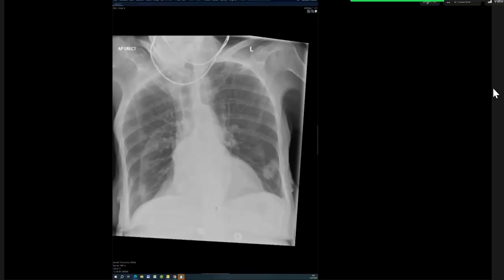There is no appreciable hiatal hernia lower down, so I'm wondering whether this represents a central mass. This triangular opacity adjacent to the heart is suspicious for peripheral atelectasis. I would like to do further imaging of this patient to assess things further. I am suspicious of underlying malignancy. I would like to know more about the history of the case.